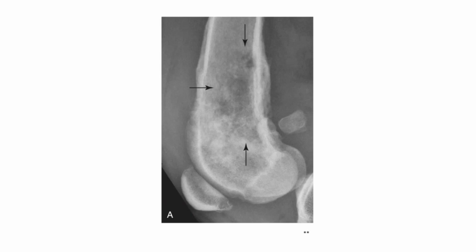Here we have a mediolateral view of a canine femur, and again we're zoomed in, this time at the level of the distal metaphysis. What we can see are a number of features that are compatible with aggressive bone disease. But what I really want you to focus on here is the fact that we have multiple areas of lucency that appear to be coalescing.